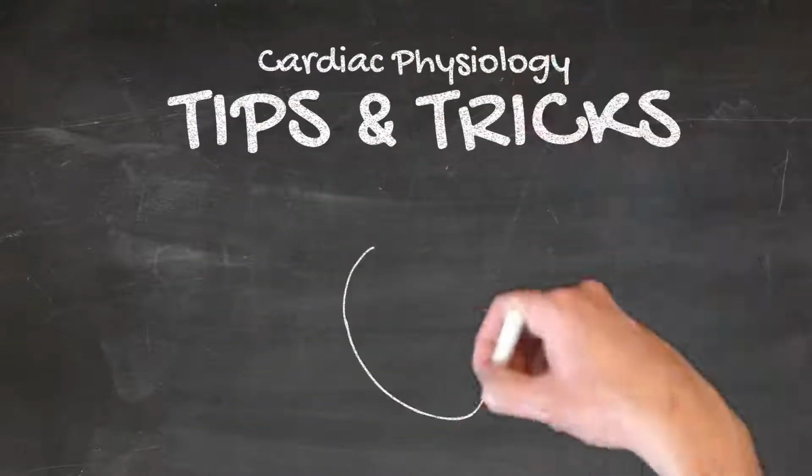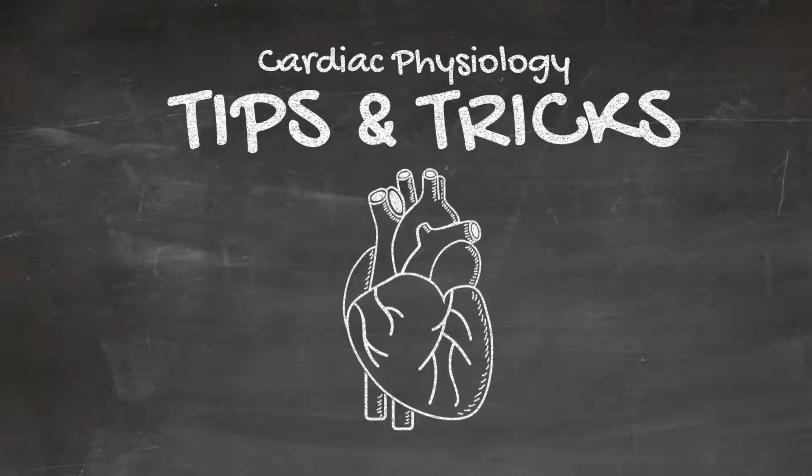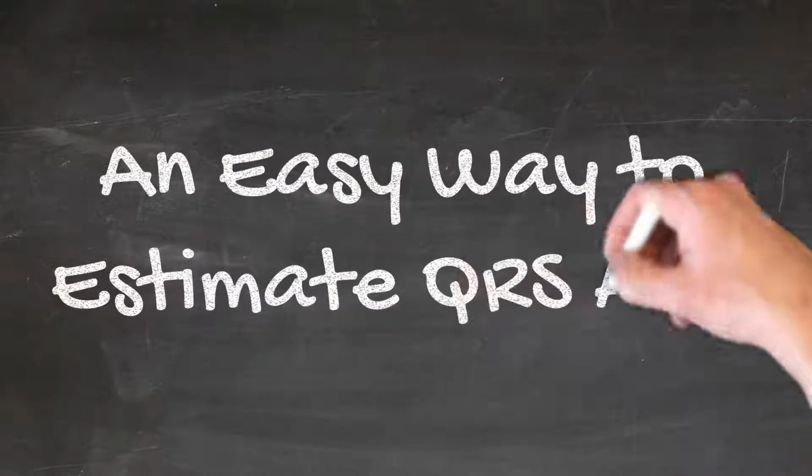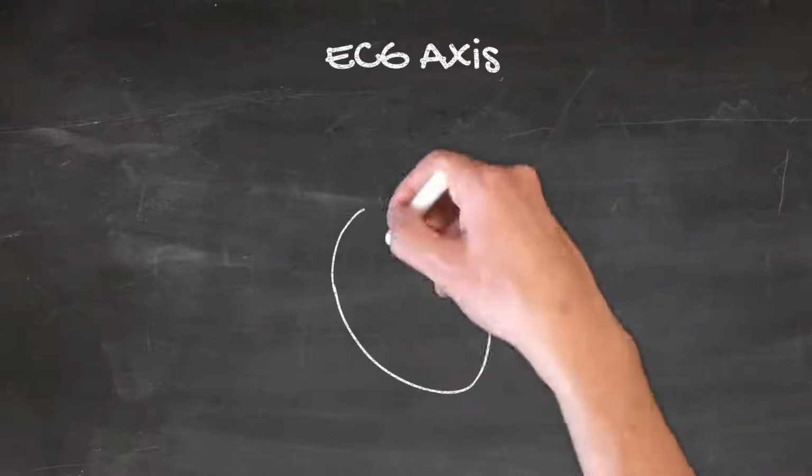Welcome to this episode of Cardiac Physiology Tips and Tricks, where we will be introducing a quick and easy way to estimate the frontal axis of an ECG. Let's start with a quick ECG Axis Recap.